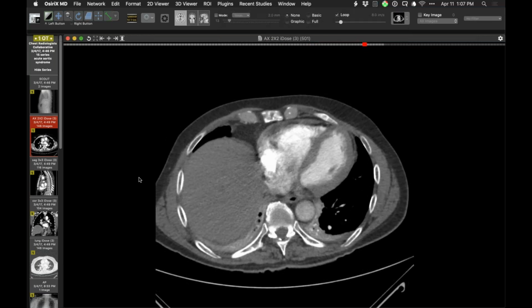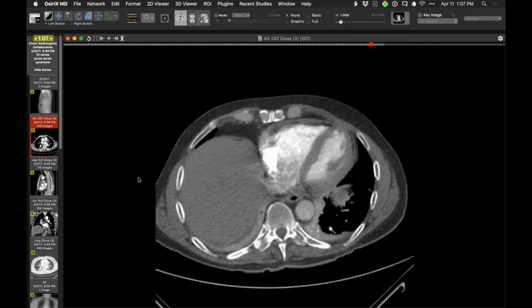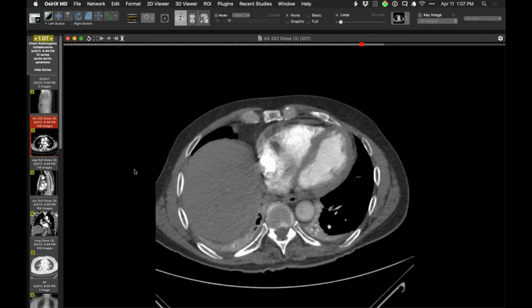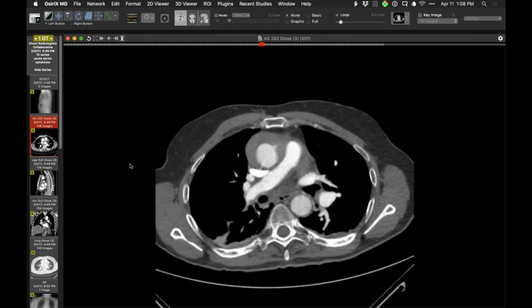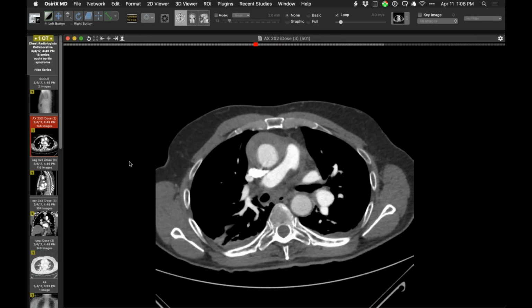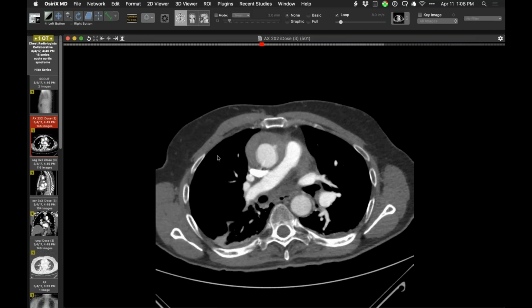And let's see if there was any in the pericardium. There's a small amount of pericardial fluid only. But when I looked at this again and again, the only place where I thought I might be able to see the communication or a potential communication between the true lumen and the wall is maybe there. But that is all that I saw.